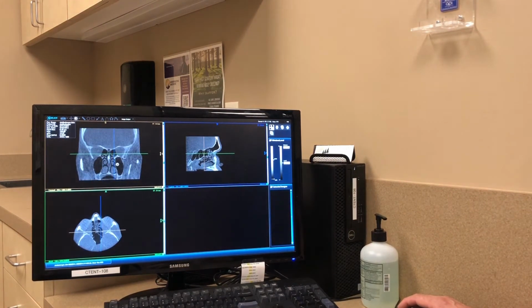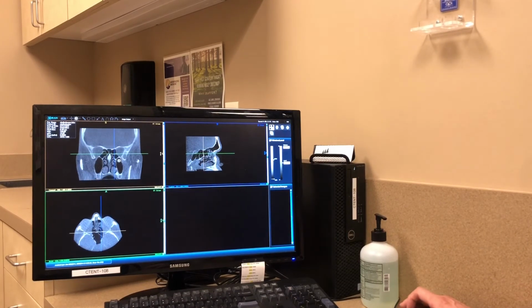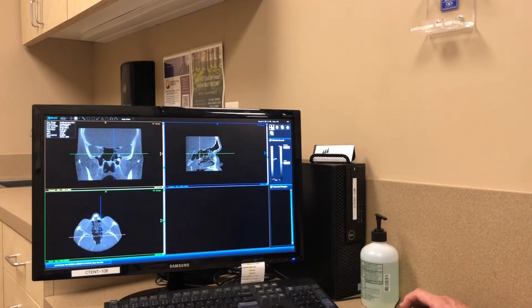These right here are the cheek sinuses, or the maxillary sinuses. I've actually got a little bit of sinus disease. Back in 2014 at least I did. That tiny little rim of gray is a sign of sinus inflammation there. Sinuses between the eyes are right here, between the eyes. These are called the ethmoids. And at the very far back of the nose, there's these sinuses called the sphenoids, okay?